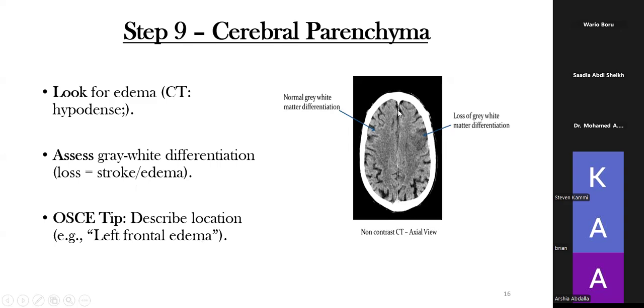So is it left frontal? Like this one probably would become left parietal. So number one, on which hemisphere is it? Is it left or right? And then what lobe is the lesion? So this is an example. You can even have a bleed in the frontal lobe. So I'll show you some scans and we can go through them.